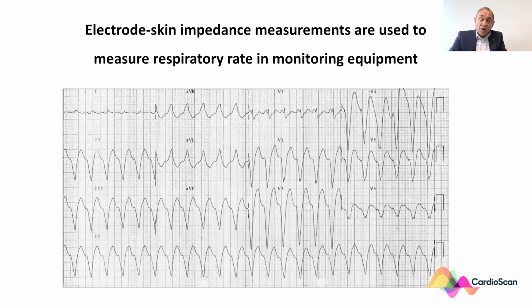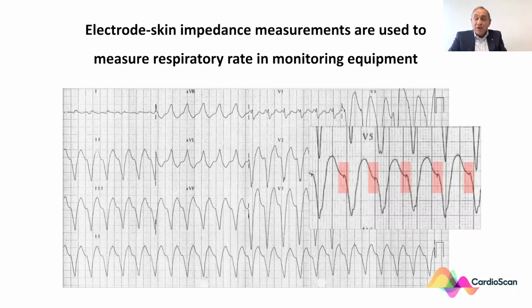After many unsuccessful shocks and many drugs, the patient was transferred to another hospital, the monitoring equipment was removed, and the heart rate went back to normal immediately. You can see there are small spikes here indicating that this is ventricular pacing at its maximum rate.